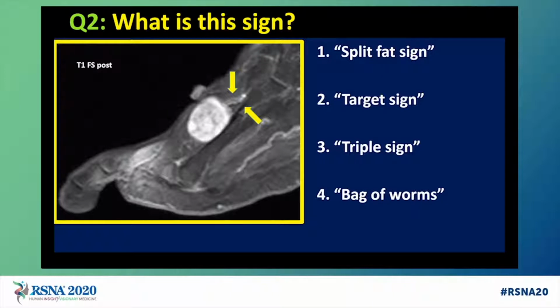Is it 1, a split fat sign? Is it 2, a target sign? Is it 3, the triple sign? Or 4, a bag of worms sign?